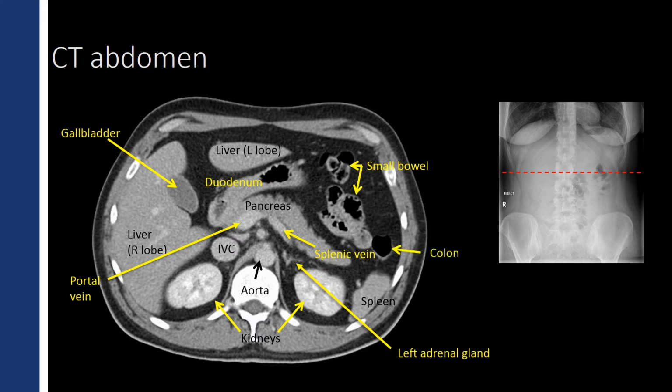And we see some small bowel, and we see colon. Now, I wouldn't expect you to know necessarily always what is small bowel and colon. Colon usually will be more around the outside of the abdomen. Small bowel will be more within the mid portion of the abdomen. But sometimes you just have to scroll through several slices in order to determine what's small bowel.